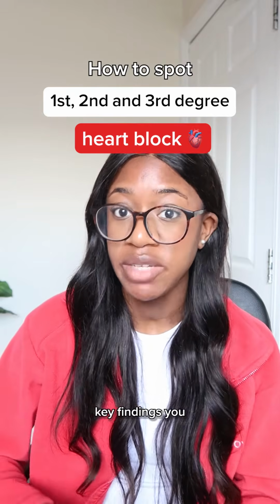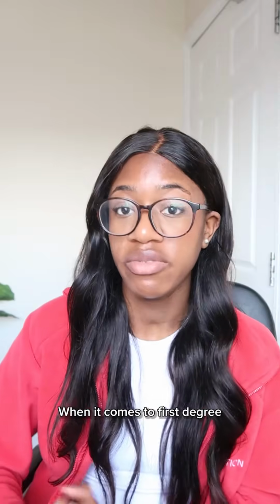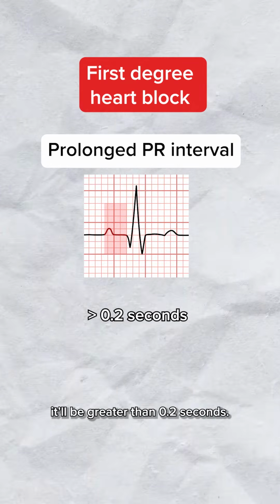One of the key findings you need to be able to spot on an ECG is heart block. Here's how to spot each of the three types. When it comes to first degree heart block, this is defined by a longer than normal PR interval. Normally the PR interval is 120 to 200 milliseconds, but in first degree, it'll be greater than 0.2 seconds.